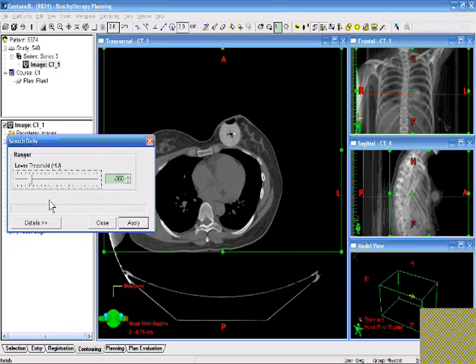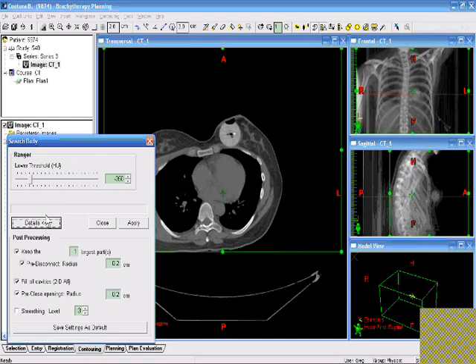Now, you can see that by default you get this small dialog box. If you ask for the details, you see what all the defaults are. By default, the search body will have the smoothing turned on at a level of about 3, and that is causing the problem, that artifact. So in order to get around that, what you need to do is open the search body dialog, ask for the details, turn the smoothing off, and then save these settings as the default so that when it does it in the future, it will not do smoothing.